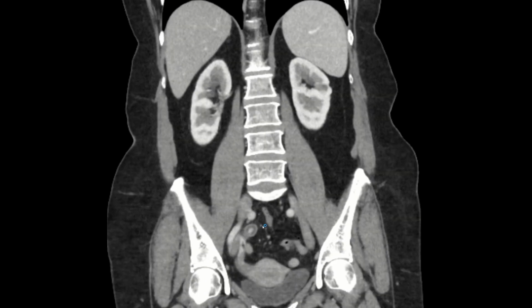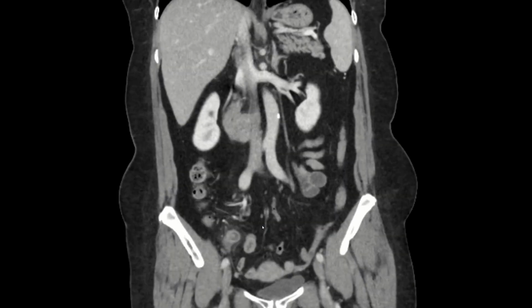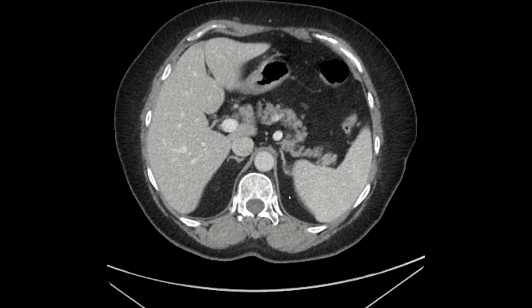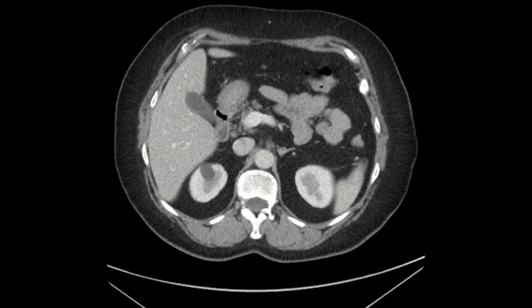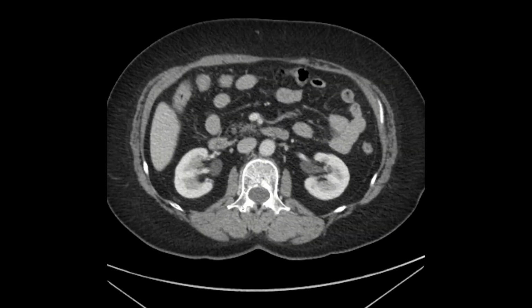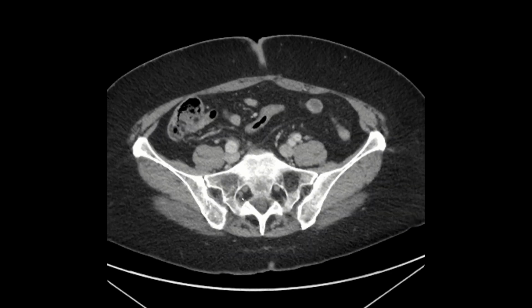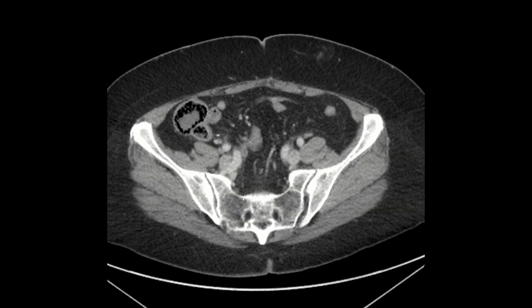ends. So this patient underwent a laparoscopic appendectomy, and 3 weeks after the procedure they presented again with abdominal pain and fever. And here is the CT from that time, and again we are following from superior to inferior. We find that the appendix is absent, but in the pelvis, these are post-appendectomy changes right here.